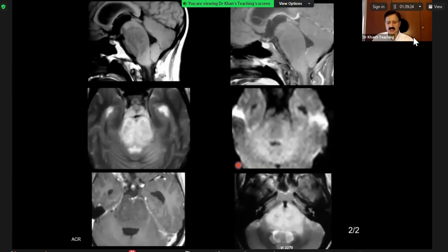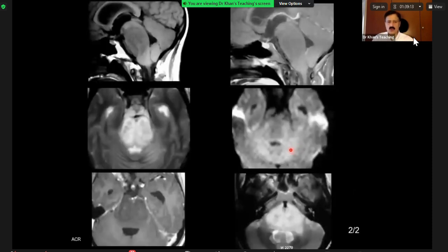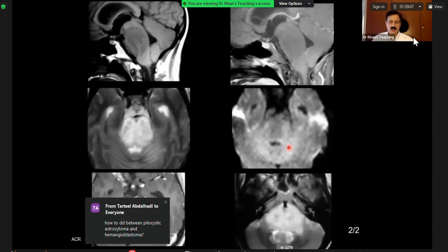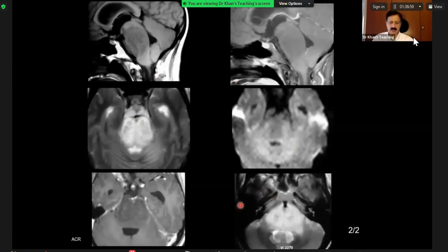On CT scan, particularly axial, you can see that there is hypodensity, and these lesions go up through the tracts, so corticospinal tracts, etc. So this type of lesion you can miss if you are not very careful, because it will cause diffuse findings. Our case on an MR becomes quite easy to pick up.